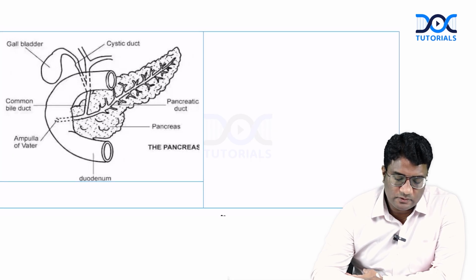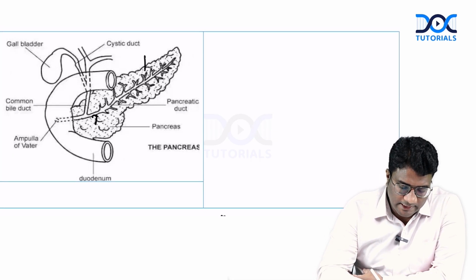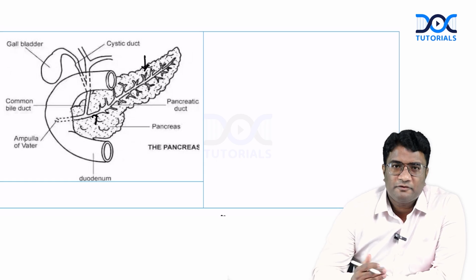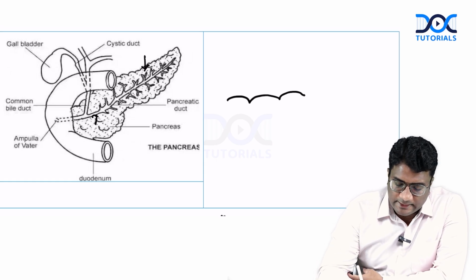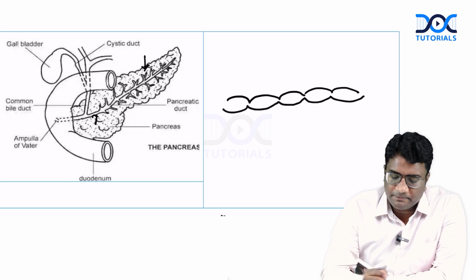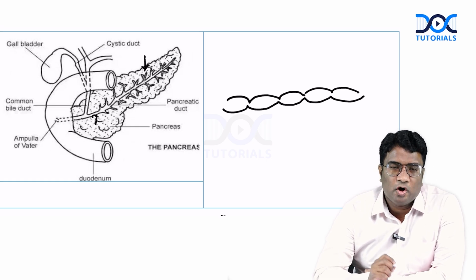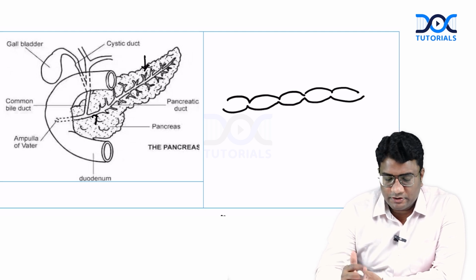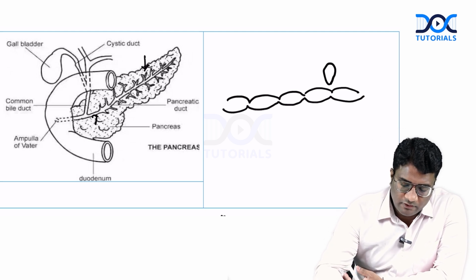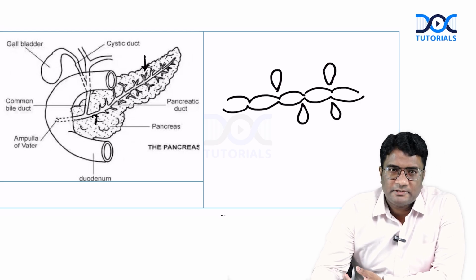Look at here. This is the pancreas. It is having the main pancreatic duct and the side branches that you have. So when you have chronic inflammation of the pancreas, you see stricture and dilatation of the main pancreatic duct, producing a corkscrew appearance or tortuous appearance or beaded appearance of the main pancreatic duct. The stricture and dilatation of the side branches produces chain of lake appearance.